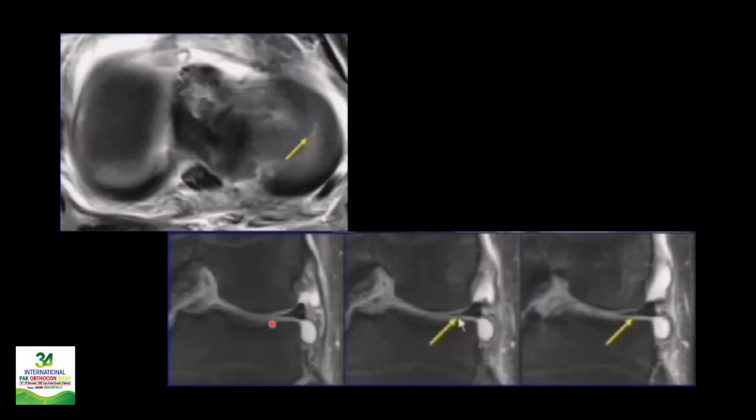So you can appreciate that in this image, the tear is more towards the free edge, whereas as I cross to the next one, it is going to be migrating towards the outer side, away from the free edge of the meniscus. If you see this migrating meniscal fragment, this is going to be indicative of a flap tear.